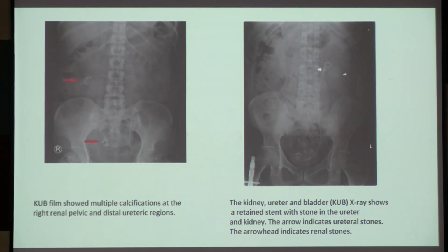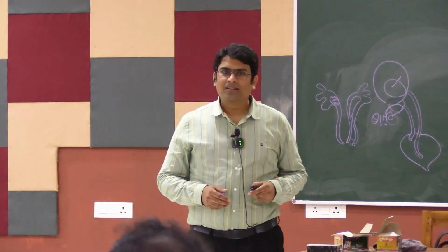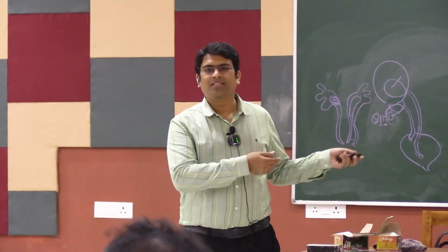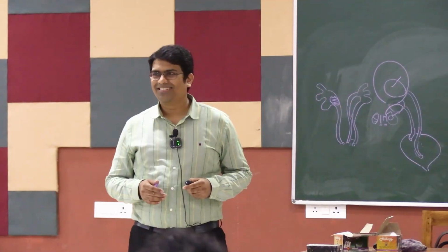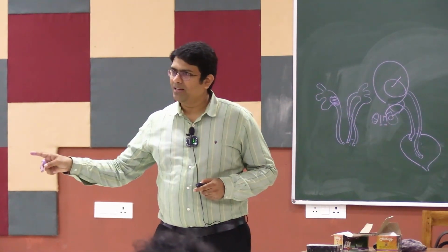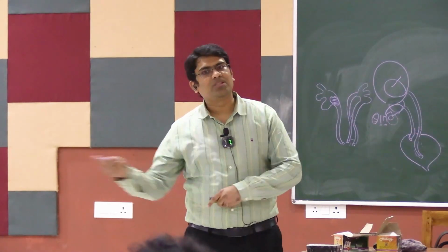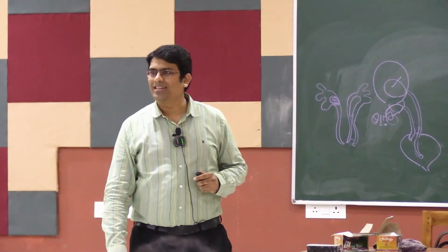The interesting question is whether it is a gallbladder stone. How will you understand it's a gallbladder stone? This is the question that is asked in the examination. So I am saying it's a radiopaque stone. Now tell me how it is to be understood. There is a 10% chance gallstones are radiopaque, and a 10% chance renal stones are radiolucent. I am saying both of them are radiopaque in this situation. How will you understand which it is?